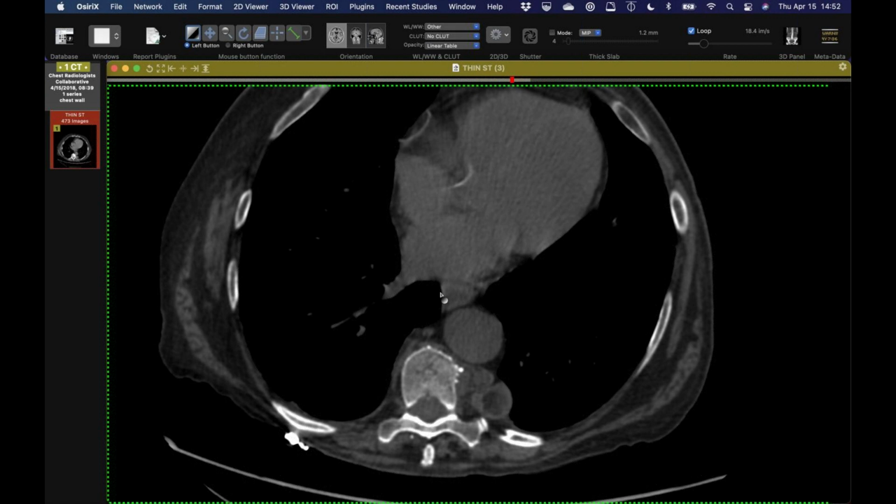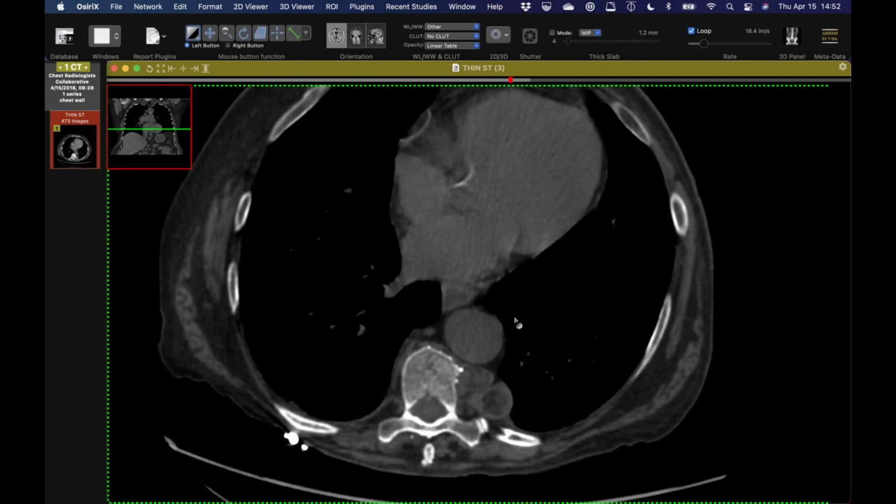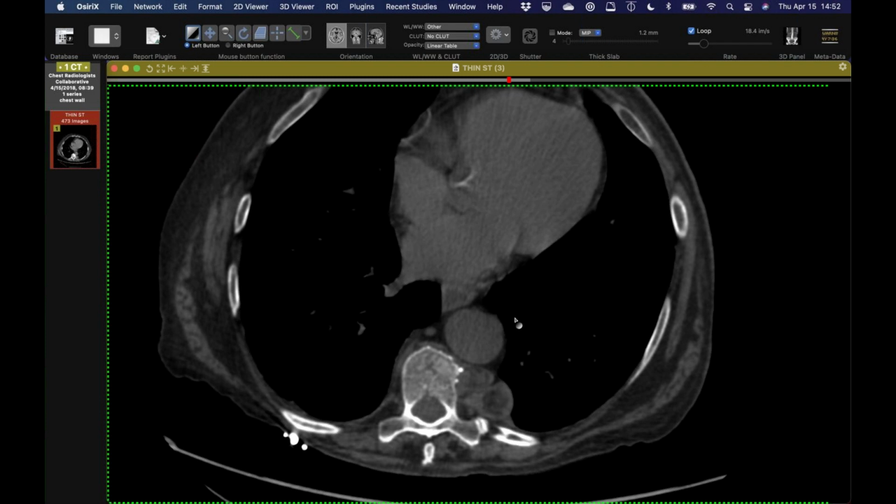it's very uncommon. And one of my colleagues looked it up quickly and found they reported about a 3% extra-adrenal frequency, which I suspect is probably oversampled, because we see myelolipomas not uncommonly, and I've never ever in all my years seen one outside of the adrenal gland. So in the chest is really rare. But it makes sense: if you put this lesion in the adrenal gland, you'd be happy calling it benign and probably a myelolipoma. Have any of you ever seen one in the chest?